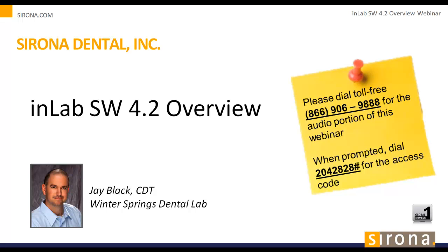It's an amazing update, giving us some new tools that allow us to be more efficient. We now have a virtual articulator, which can help us reduce finishing times at the lab and chairside. We have a new design mode called Multilayer Definition, where we can split a full contour design restoration into an upper veneering structure and lower framework structure in multiple sections. We have a new bridge abutment multi-layer feature where we can split our full contour bridges into bridge work and separate custom abutments, all from one scan.